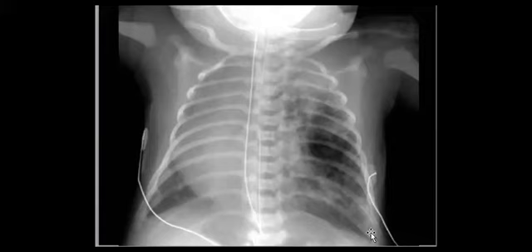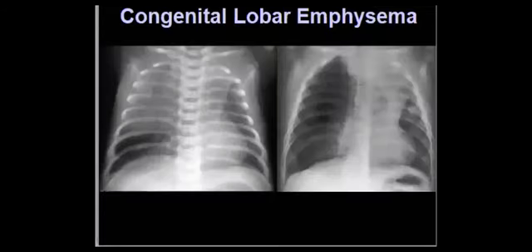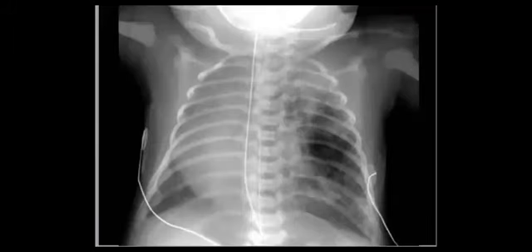There are many types, and it depends on the cystic appearance of these lesions. So focal lucency, it can be the CPAM, congenital lobar emphysema. In this case, yeah, or this case. So put it in your differential diagnosis. Okay.